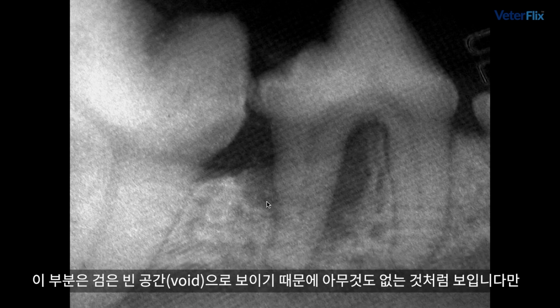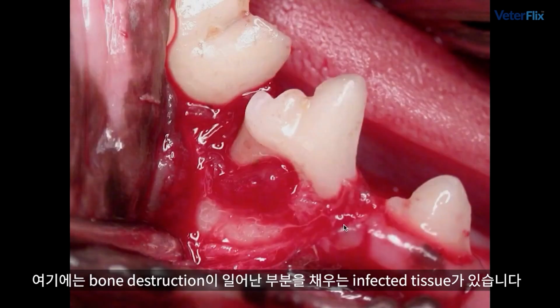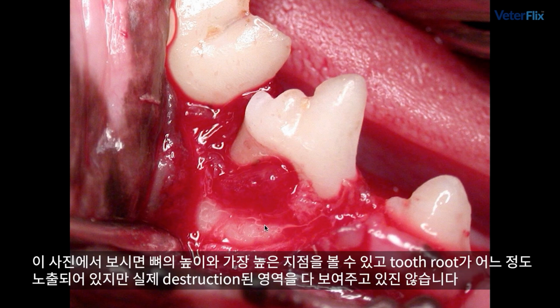Now, this looks like there's nothing there because it's just a black void, but in reality, what we have is a lot of infected tissue here filling that area where the bone's been destroyed. So here is the level of the bone at its highest point, and as you can see, the roots are somewhat exposed here, but this image doesn't really depict the true reality of the destruction.